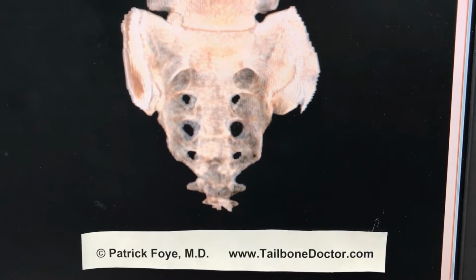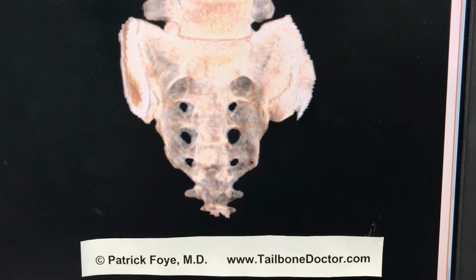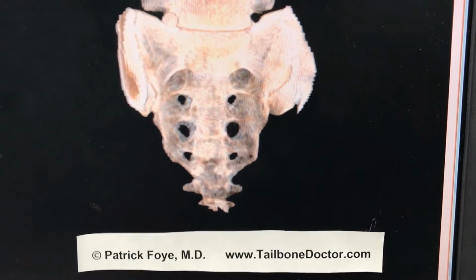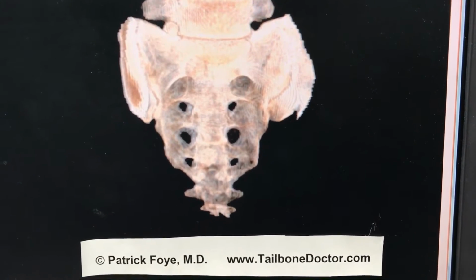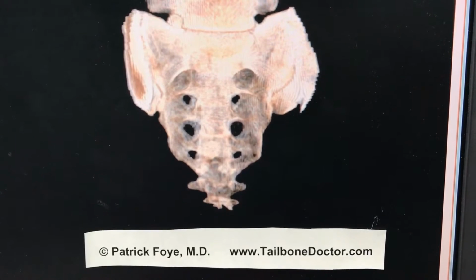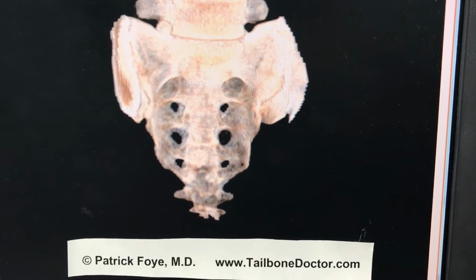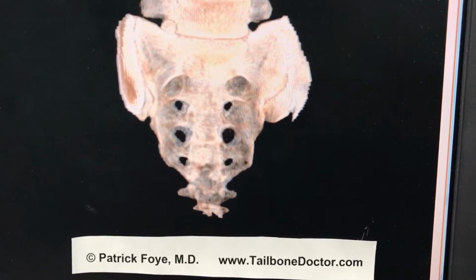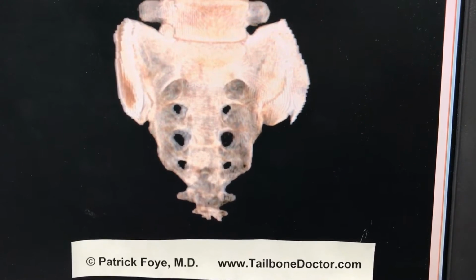So the majority of times when we're doing our imaging studies for patients with tailbone pain or coccyx pain, coccydynia, we're using things like x-rays, which medically we call radiographs. Standard x-rays to look at the tailbone, especially x-rays done while the patient is sitting versus standing, can be hugely helpful. In other patients, we may need advanced imaging studies such as MRI to look at additional detail. But about 1% of the patients I see for tailbone pain may benefit from what's shown here, which is a CT scan, a CAT scan, computerized tomography scan, specifically with three-dimensional or 3D reconstruction.